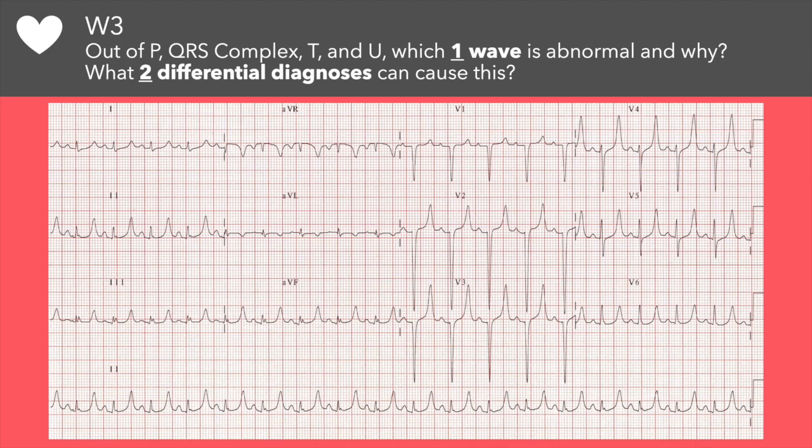The potassium was 7.0. While large T waves could also mean hyperacute T waves in early ischemia, especially if the QRS can fit under the T. Other potential looks of hyperacute T waves include a T wave where the upslope is straight, and the new upright T wave in V1 in a person with cardiac symptoms.